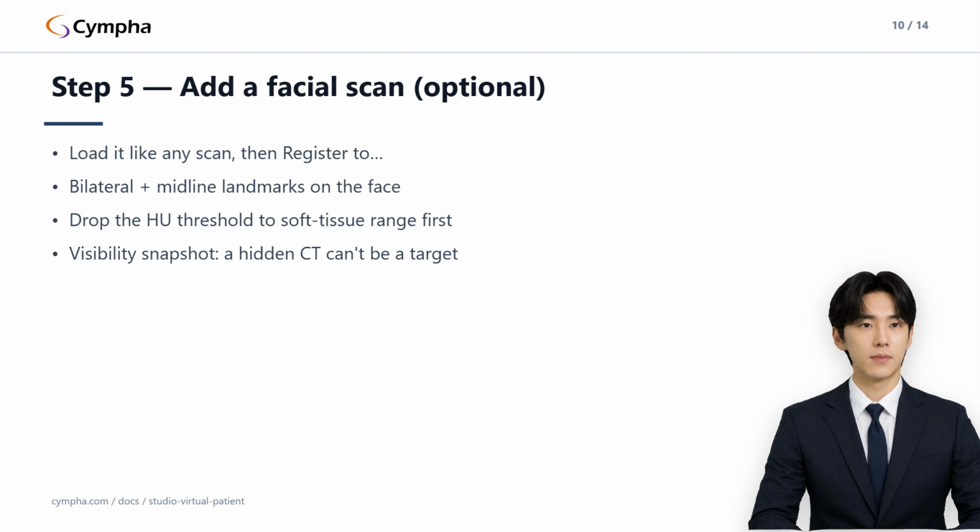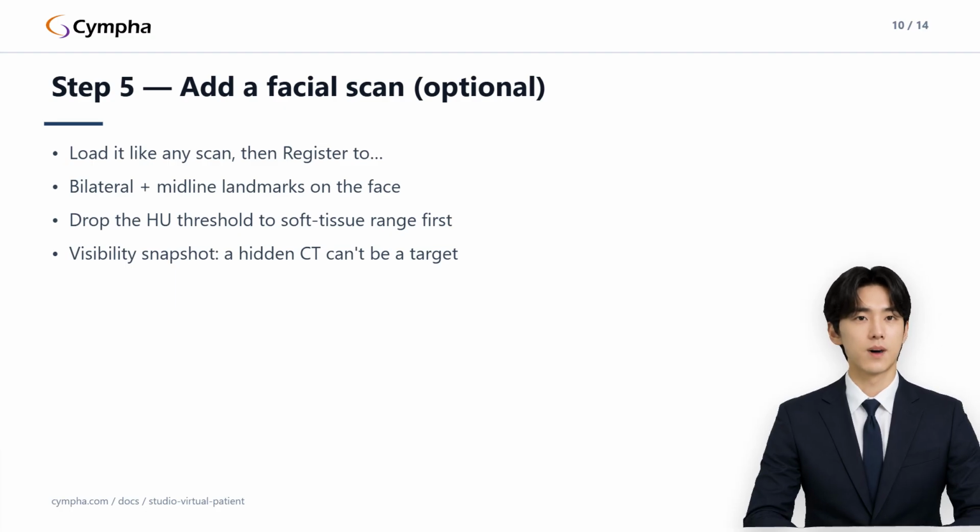Extraoral shots, smile shots, panoramic screenshots. These are gallery only. They live in the media gallery behind the pictures icon on the top toolbar, and they never bind to a mesh as a texture. You can attach a comment to each picture, and the comment is stored with the project, which future you will appreciate. There's also the screen capture button, the camera icon on the top toolbar.